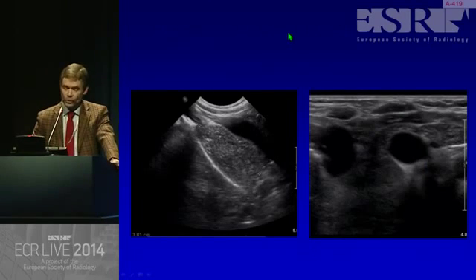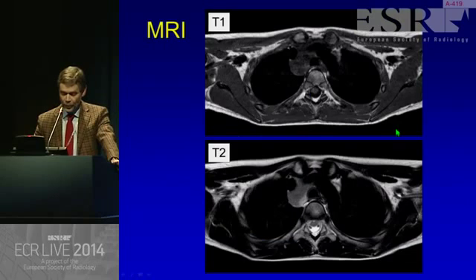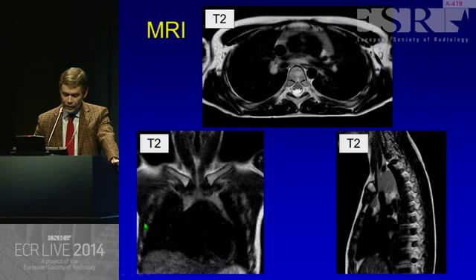First of all, ultrasonography, of course, and we can see the coarse texture of the deep structure, but also the ventral structure has the same coarse texture. So on MR, this looks the same as this, the same as this, and if we look at the T2, the anterior part, this is how thymus looks, even at this age.